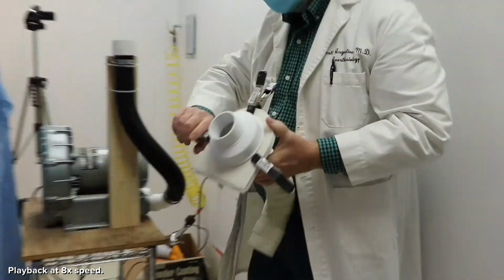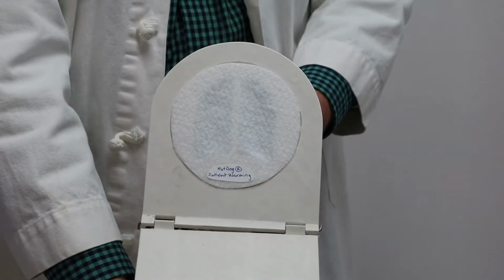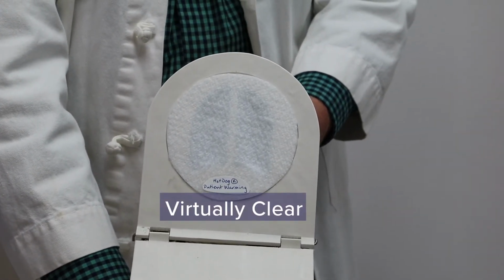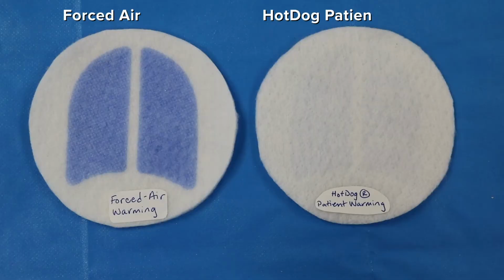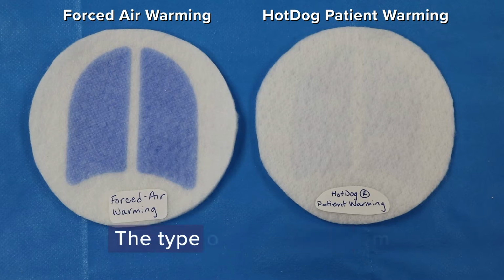The filter is removed to reveal inhaled contaminants. With the HotDog system on, the lungs remain virtually clear. What caused the drastic difference in the amount of inhaled particles? The conditions in each group were identical except for the type of warming system used.